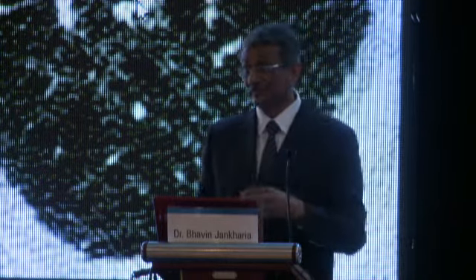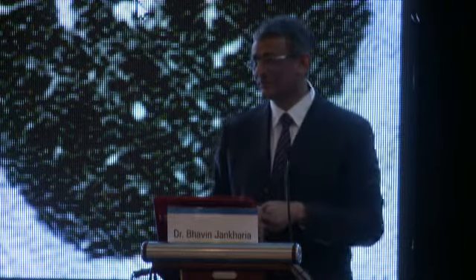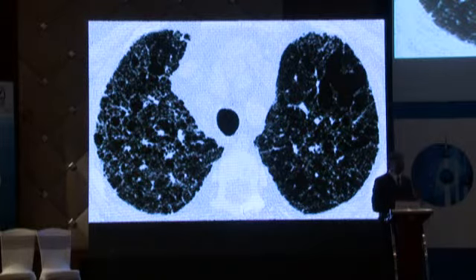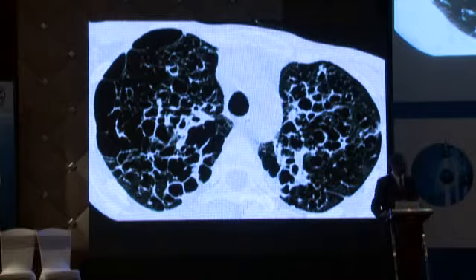And so when we see a cystic lung disease like this, while the textbooks and papers would tell you that there are ways of differentiating one from the other, in real life it's extremely difficult. In real life, if he's a male smoker, it's histiocytosis X. If you're a woman non-smoker, it's lymphangiomyomatosis. If you're a woman smoker, then we're all in serious trouble. So that's the time that you go ahead and biopsy them, because then you don't know if it's the smoking that's producing histiocytosis X, or the woman who's getting lymphangiomyomatosis, because that pretty much occurs only in women. So that's how we differentiate one from the other.